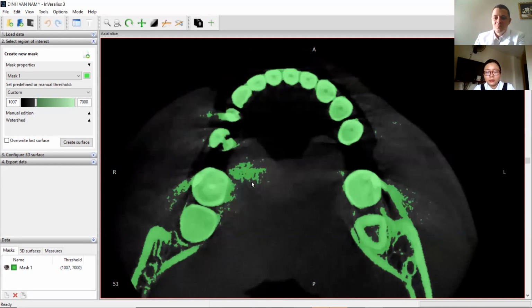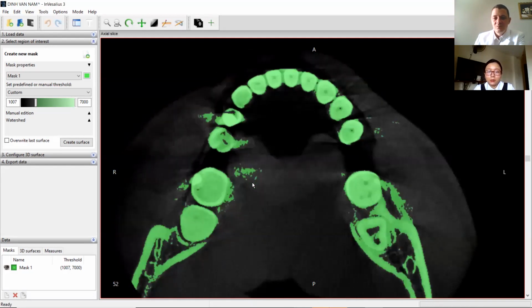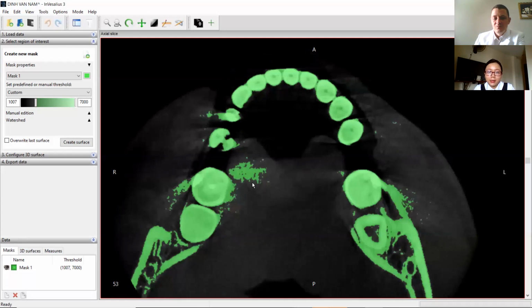Mình sẽ thấy một điều rất là thú vị mà mình sẽ không thể thấy được ở những phần mềm chuyên nghiệp khác. Tại vì phần mềm chuyên nghiệp thì nó sẽ xóa đi hết những phần này, thì mình sẽ thấy là cái phần xanh xanh ở giữa đấy mà bác Nikolai đang chỉ chuột vào đấy, đó chính là cái phim CBCT đang nói với mình rằng đang có một vật thể khá là đặc ở đây.